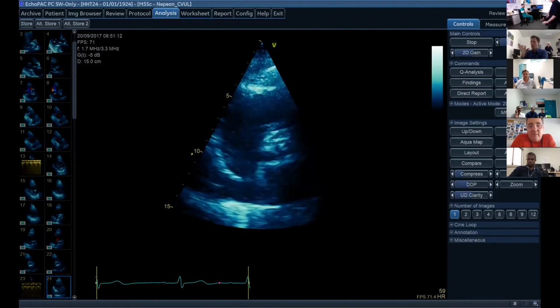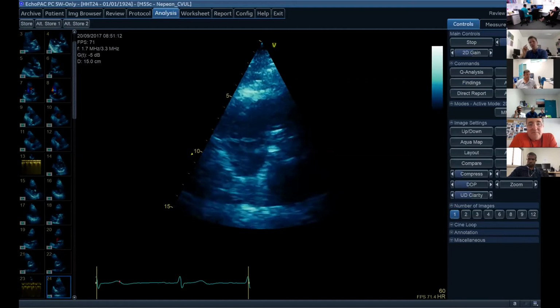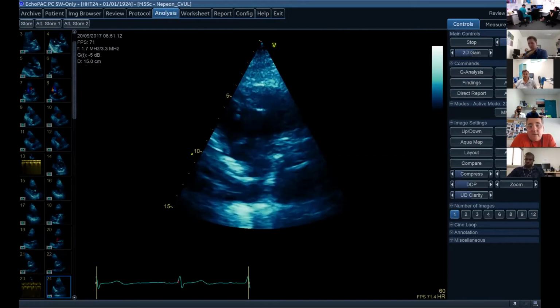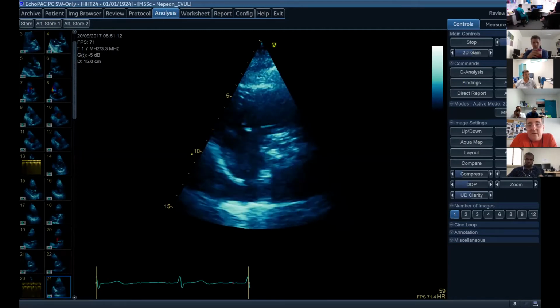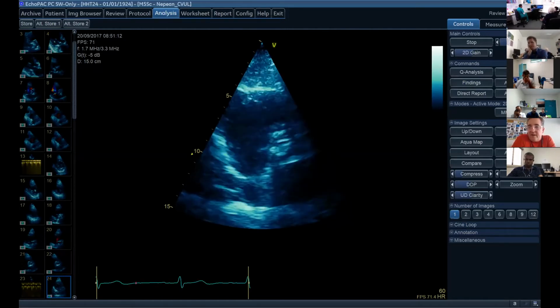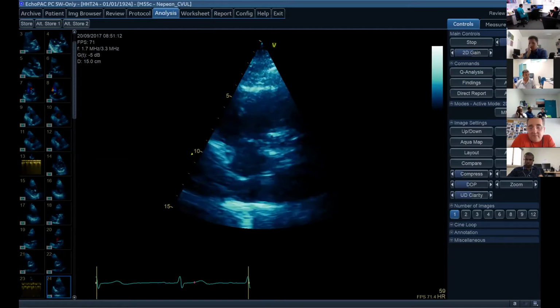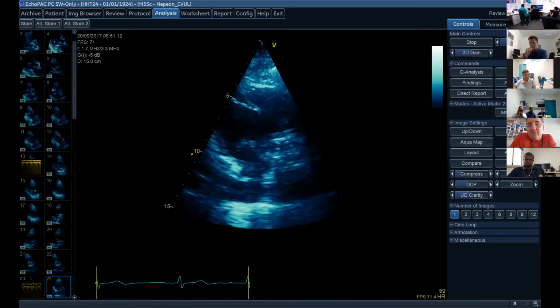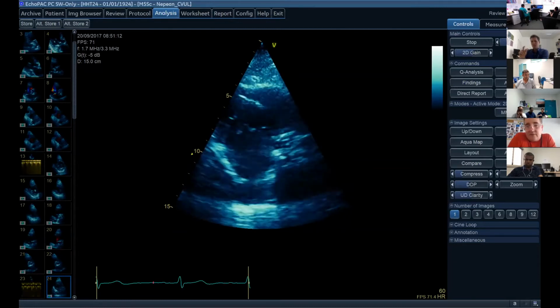Fantastic. And why do you say, if I gave you a better picture so that we could even have an attempt at it, why would you or would you not use it in this kind of situation? I think it's an important finding in that it is a positive finding if it is under 1 centimeter, even if you are suspicious as to the quality of it. I think you then will need to bring in other parameters to assess the severity, primarily Doppler related, but also 2D looking at sequelae such as the right heart and left ventricle. Nice. Let's just stick with the planimetry for a little bit.